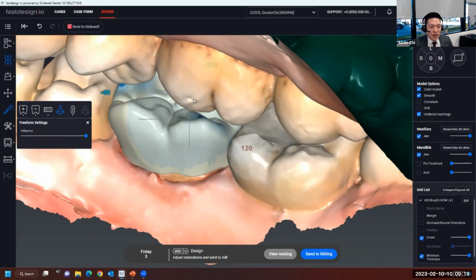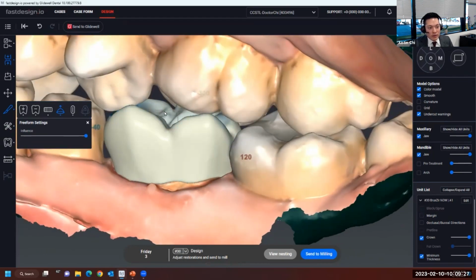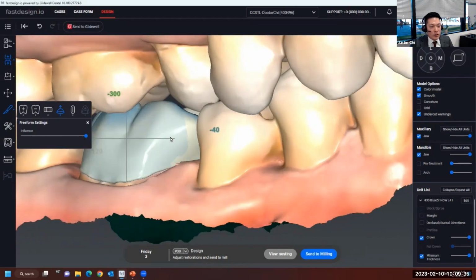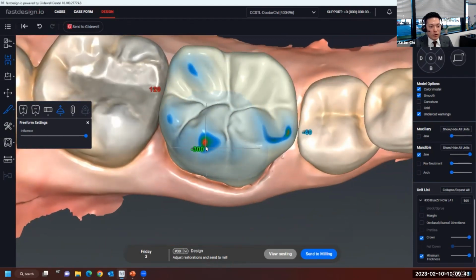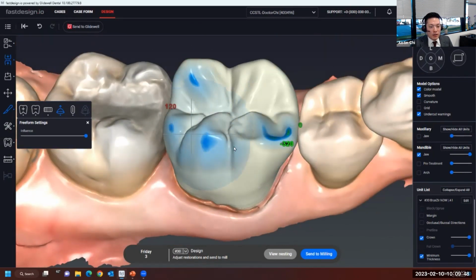No occlusal philosophy out there has been written to satisfy the requirements for this type of case. So you really have to take the general anatomical form that the software provides you, which is a 5-cusp mandibular molar, and then how can you best engage that anatomical shape with the opposing? And so you can see these tools, they're giving you an opportunity. We went from fewer contacts or fewer and heavy contacts to now we've kind of distributed a little bit along the mesial to distal on the buccal, our functional side, and maybe a light engagement on that distal lingual.